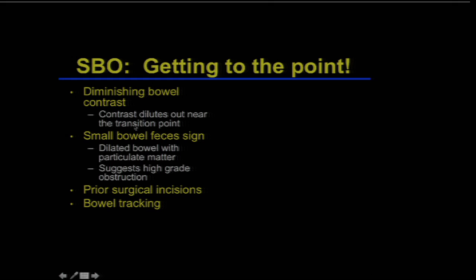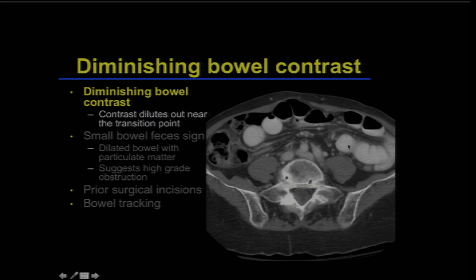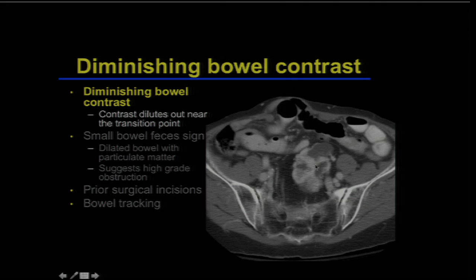First of all, I like to give oral contrast for our patients with a bowel obstruction for this reason. We can see the contrast is going to fill up the proximal bowel, and there's quite a lot of contrast in dilated segments of bowel in this patient. Ignore the pelvic kidney.